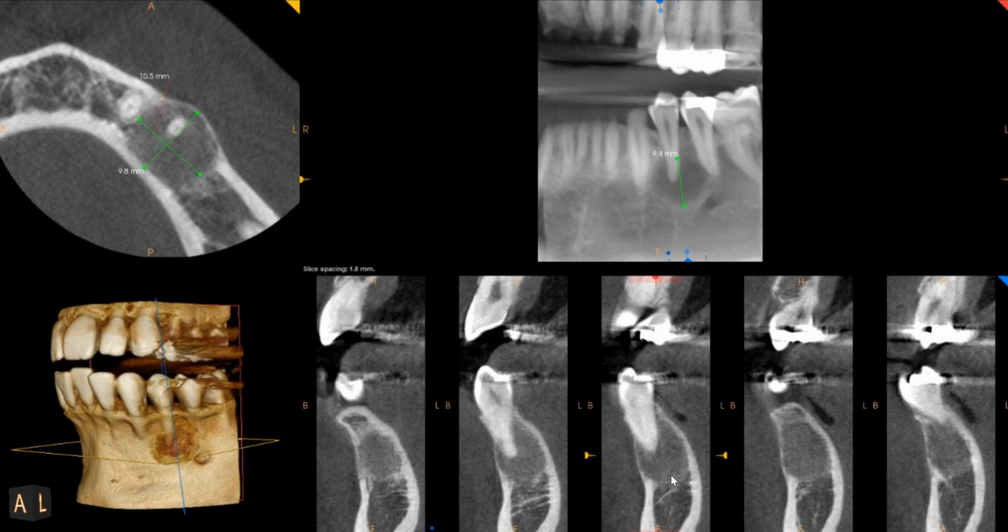Anyway, when you look at this, what would you say? This has that kind of mixed density appearance, but unusually, instead of seeing multiple granular opacities, we see these fine little specks of opacities that are present throughout this area, with that very homogeneous appearance, right?